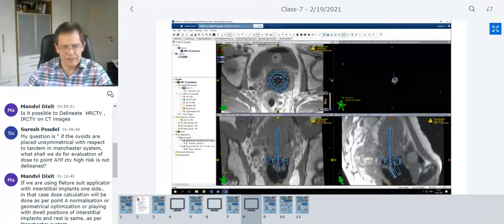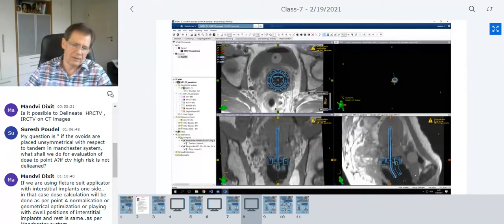So this is also the advantage if I use a solid applicator model, that we don't need to digitize the applicator and the geometry is already correctly defined. I mean, there might be a slight modification here, that I need to rotate it slightly to the right side because I see the channel coming in here, but basically it should be okay to have it like this.